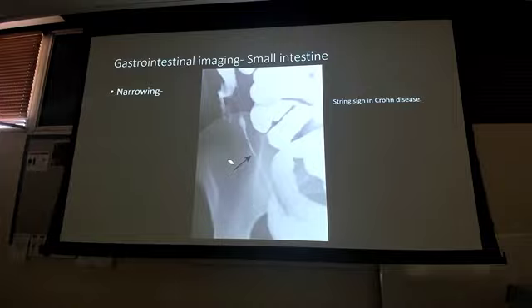On top of that, it's in the ileum. So what are we going towards? The ileocecal valve, right? Where is that typically? That's typically in the lower right side in this area, and that's where the string sign is. Is that always a guarantee? No, not necessarily. Can you get a string sign somewhere else? Yes, you can, right? But it's just other clues that kind of try to help you out.